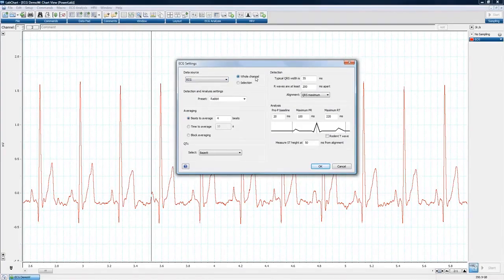Do I want to analyze this whole channel, or do I actually want to go ahead and analyze a specific selection? For this file, it's very short. Analyzing the whole channel will be relatively easy. It won't really bog down the computer. If you have many hours of ECG data that you're trying to analyze, it might be helpful to only analyze a specific selection. And I'll kind of show you how to do that later on here, just to keep the system load on the computer down.